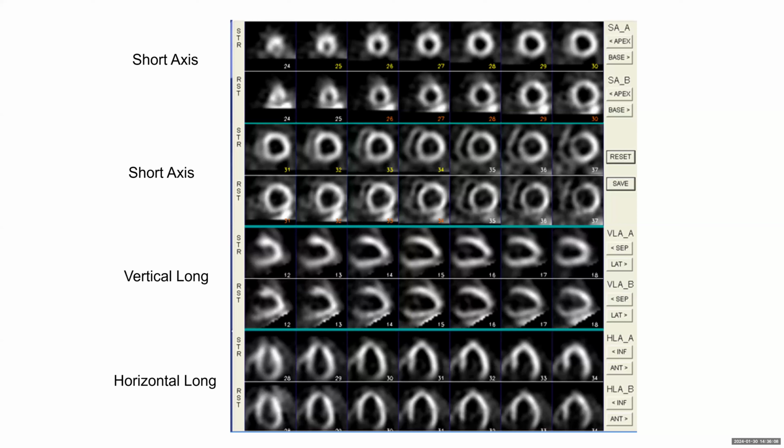Yeah, so there is a TID, there is an increased uptake in the RV, there is no focal or clear perfusion defect. However, this is consistent probably with a high risk scan and balanced ischemia. I recommend coronary angiography or anatomical assessment. Okay.